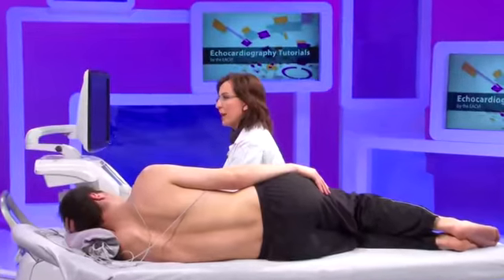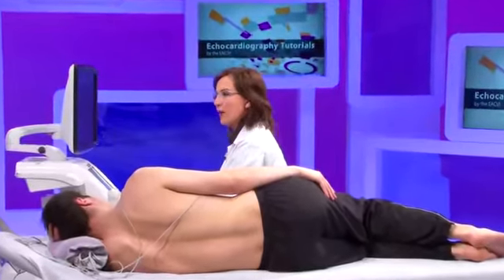The echocardiographic assessment of a patient with pulmonary regurgitation may be quite challenging for two reasons. First, because the pulmonary valve is more difficult to visualize by echocardiography in comparison with the other valves. It has a poor acoustic access. And second, because the parameters that are usually applied for assessing quantitatively the severity of regurgitation have been less validated and are less robust in comparison with aortic regurgitation.